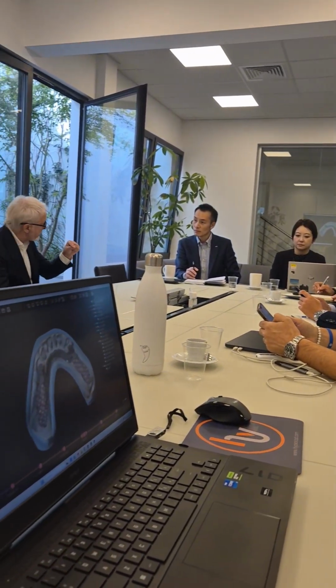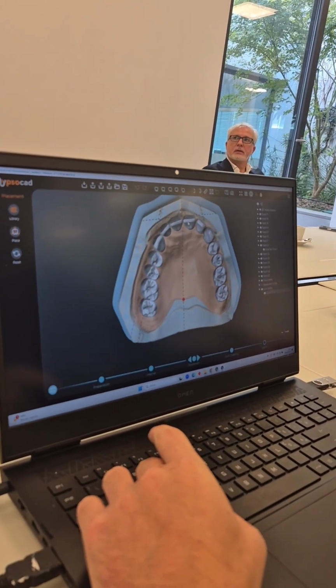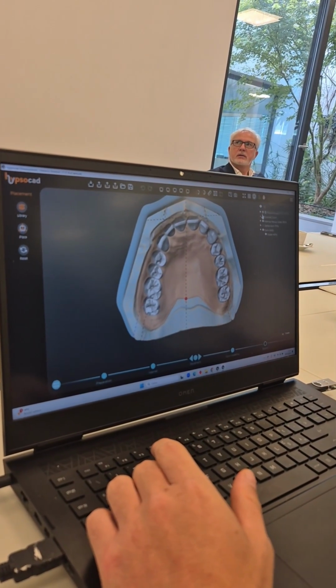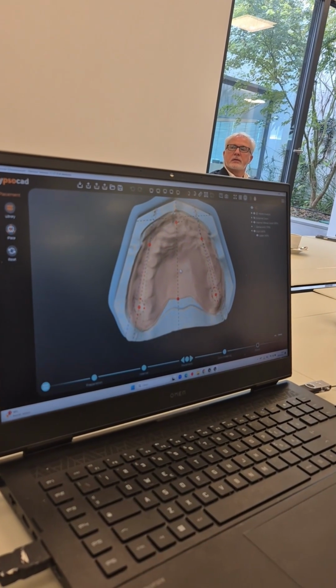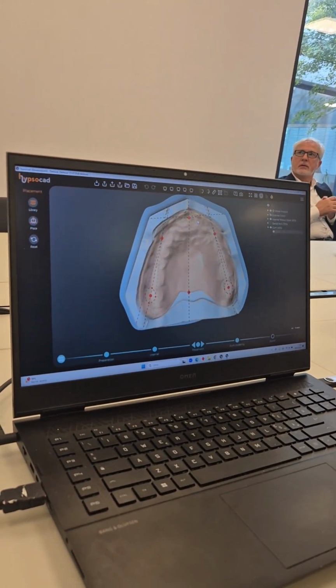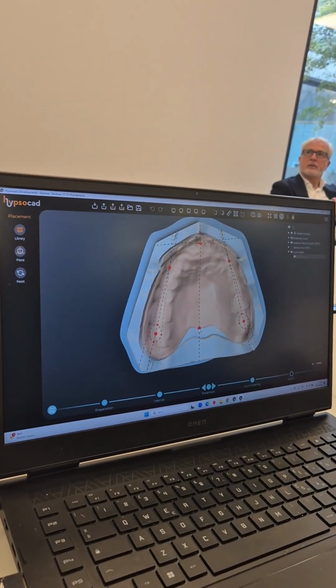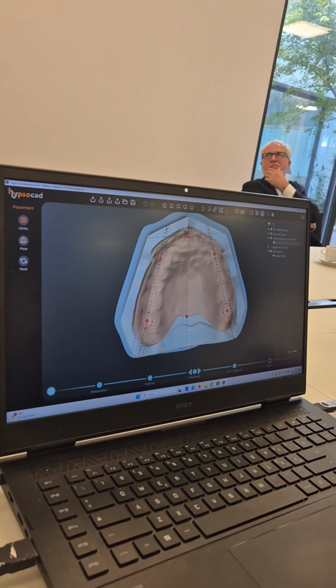In the first step, you need to select the correct part of your model. For example, you need to analyze the model and select the incisor part, the trigone, the foveae points. Automatically the software chooses a correct library.